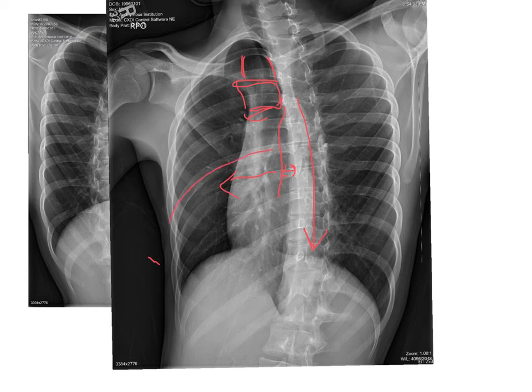We do have some elongation, but I'd like to see a little bit more, because you still have all of this up here yet to be seen in a nice elongated projection. So this RPO, although nice and clear in technique, I would have liked to see a little more elongation of these upper ribs, so we can see more of the axillary side, because that is our main area of interest.